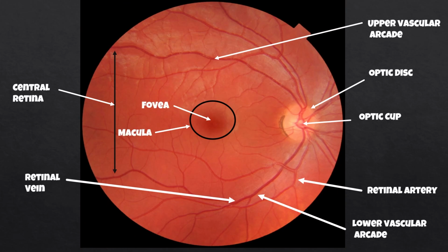Okay, so here are the answers. If you got them all correct, congratulations, you've understood the basic anatomical landmarks of the fundus and you've taken a quick idea of the fundus.